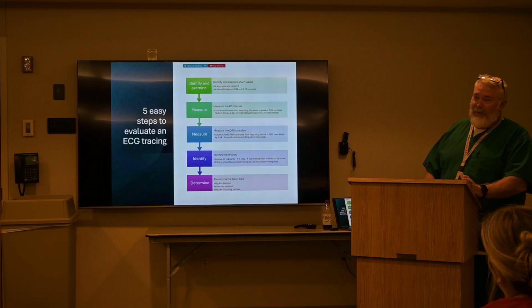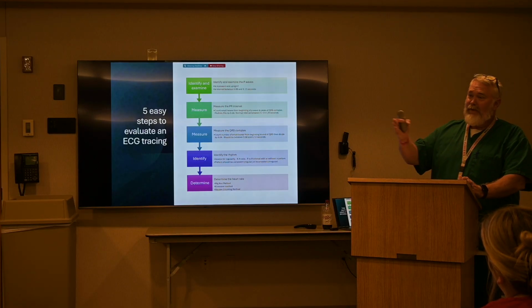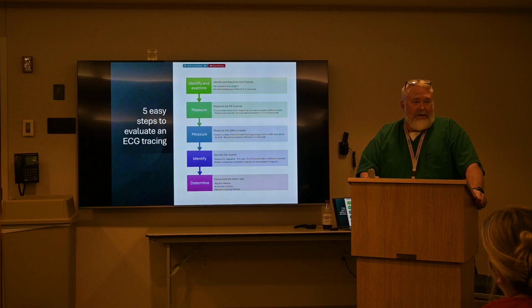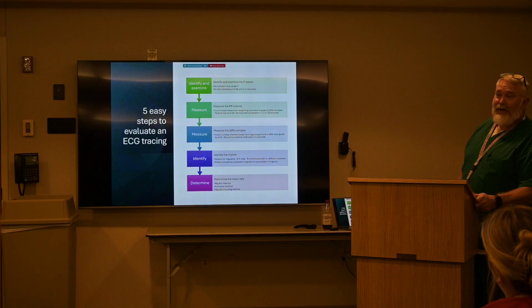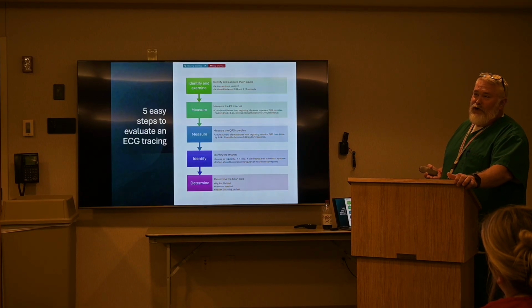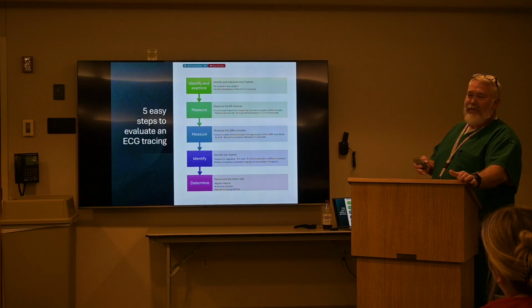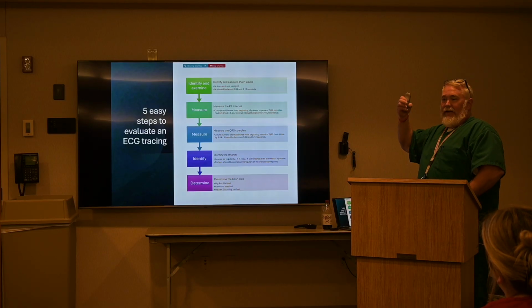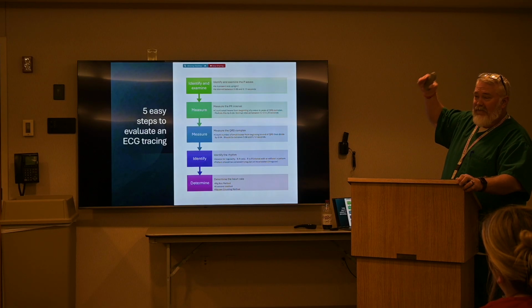But a lot of times people measure from the beginning of the P wave to the beginning of the Q wave. Technically, though, you're supposed to measure to the peak, and you could see a lot more first degree blocks if you're measuring all the way to the peak of the R wave, because that's technically the peak of ventricular depolarization.